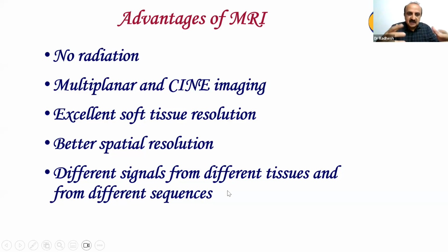It always makes you read because of these sequences. Different sequences could be T1, T2, diffusion, inversion recovery. I'll be showing you only the three or four which you need in your day-to-day practice when you put up the MR images on your monitor or on the film, on the view box. You need to know only these sequences. So remember, different signals come out of different tissues by using different sequences.